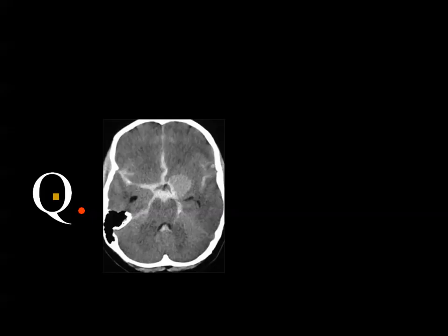Axial non-contrast CT scan of the brain.